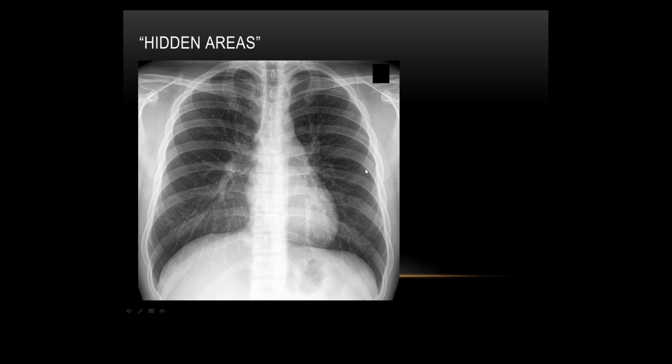The main times I use it is for when I suspect there's any sort of retrocardiac opacity. So a retrocardiac opacity, it could be some left lobe collapse, it could be a tumour, it could be even a hiatus hernia.